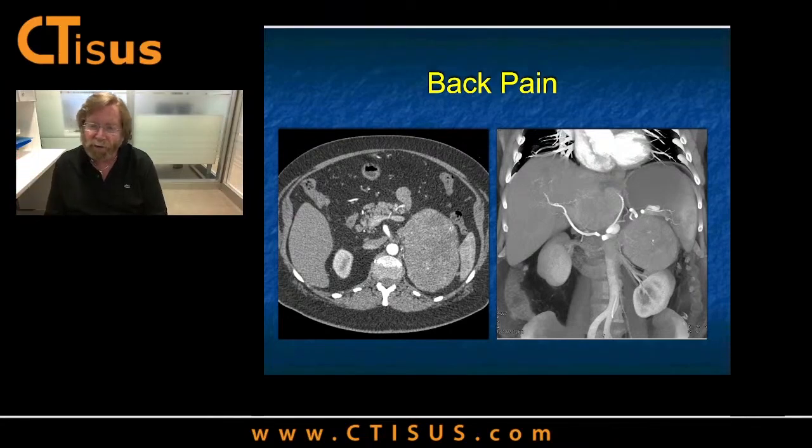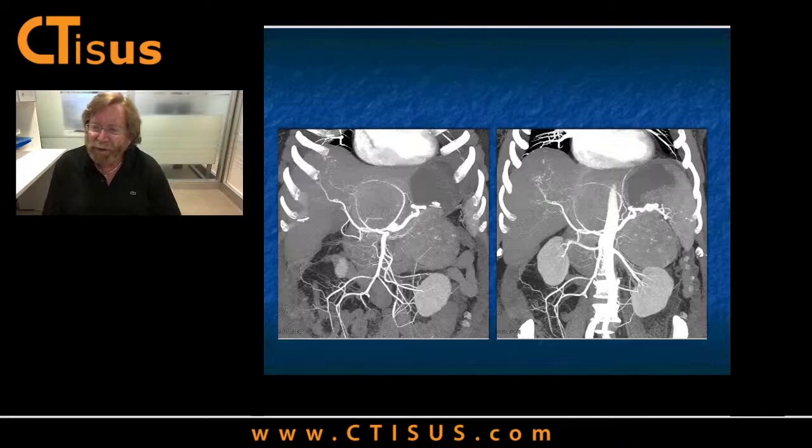They could be unilateral. Pheochromocytomas are very vascular typically, though they can be cystic. They can be large, but I'm not really thinking about a pheo in this case. This looks something malignant. Again, solid. You can have strange tumors that can be solid, but I gotta be thinking malignancy. Here it is again. There's some neovascularity in the lesion. And if you look really hard, you see this neovascularity in the liver. And that's the good hint, right?